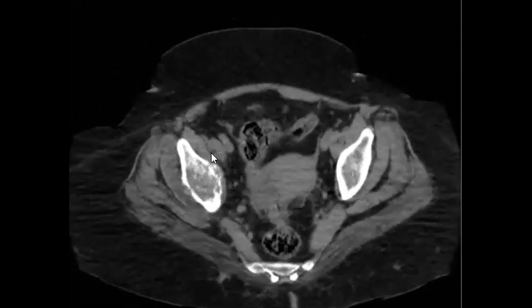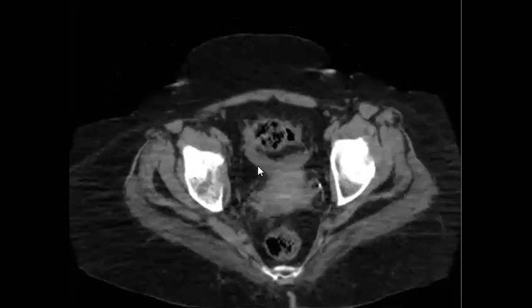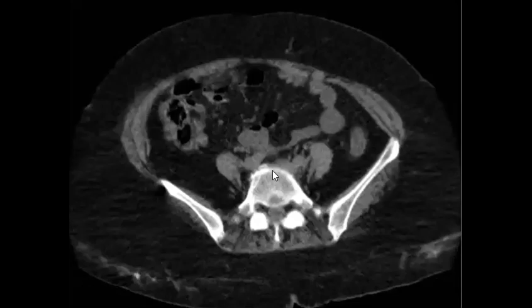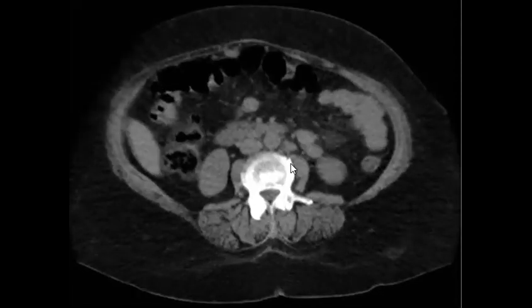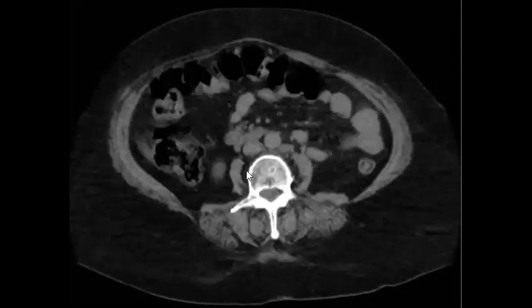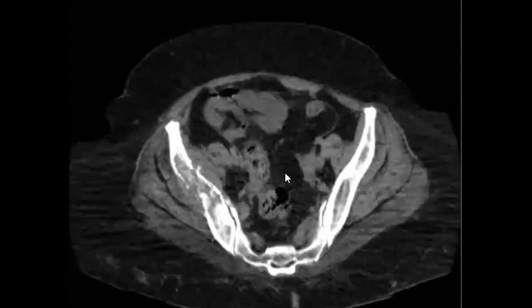So now what are you going to do? It is a real case and real practice case, so I just want to brainstorm. It can be, but the portion of the kidney that we saw is not. And you're still missing something. So perfect, Rehan. I appreciate what you are doing today.